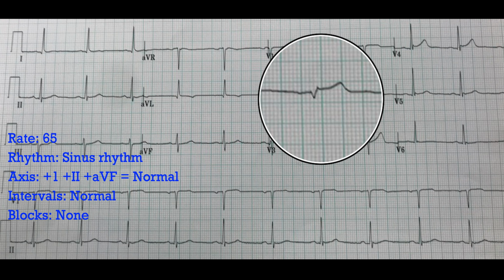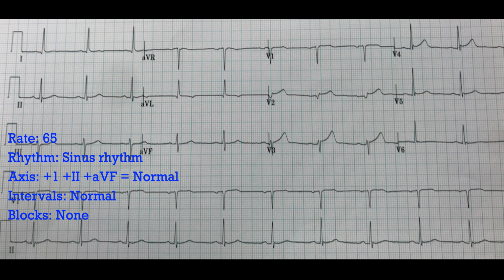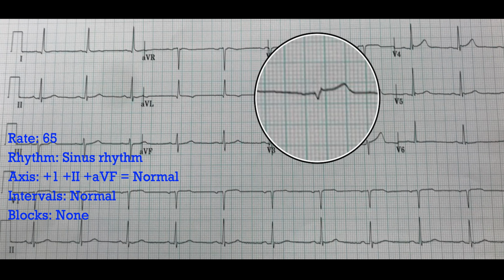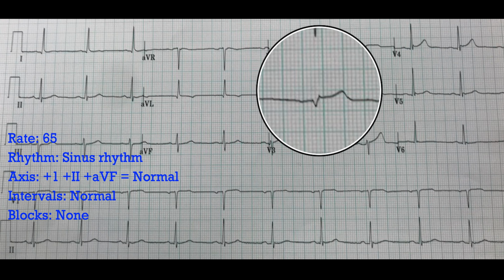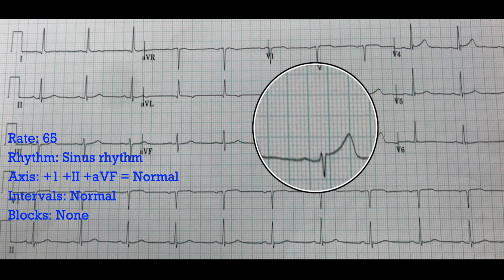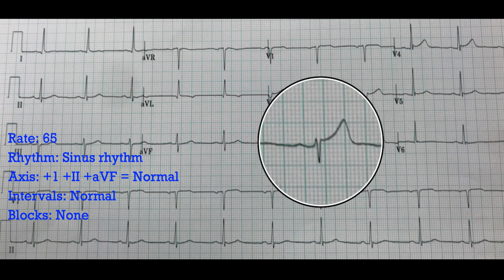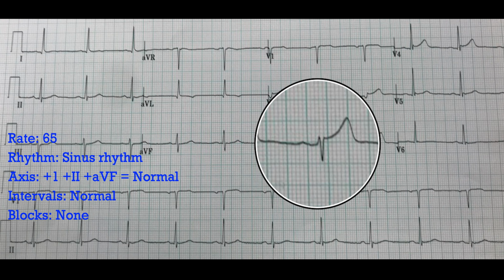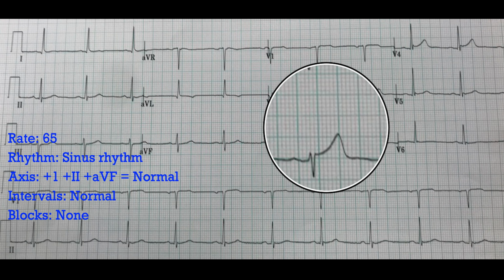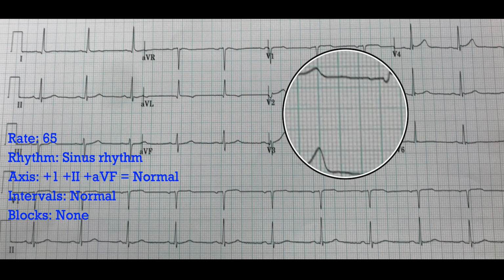And I will tell you, I'm concerned by that. When the amount of ST elevation is bigger, or at least as big, if not bigger, than the whole QRS complex, that's concerning to me. Let's see if we see anything else that looks concerning. Now, there's no obvious tombstoning here or anything like that. The morphology is mostly flat, but I'm bothered by that. That looks like there's some obvious elevation there, and I'm worried that that's something that's bad. We get a little bit of ST elevation here again, not necessarily out of the realm of possibility out here, but it's still concerning that it's up there.